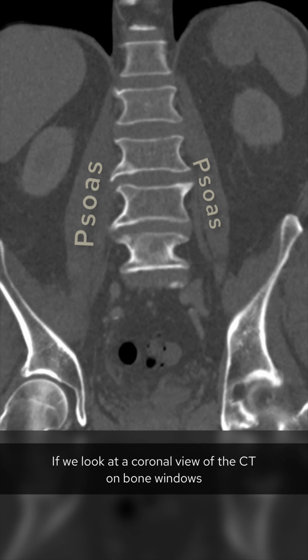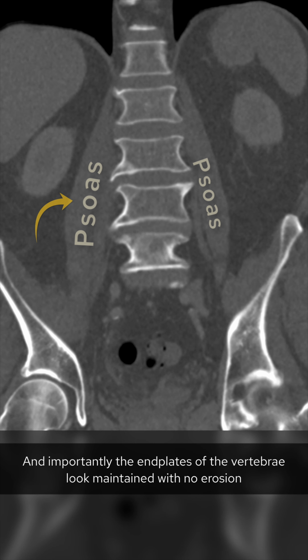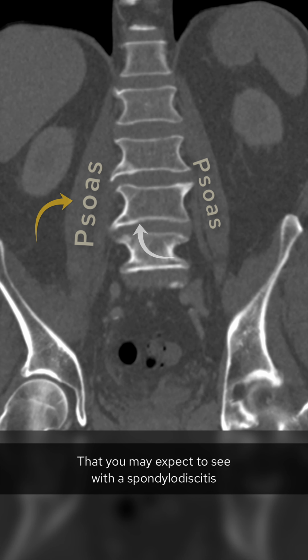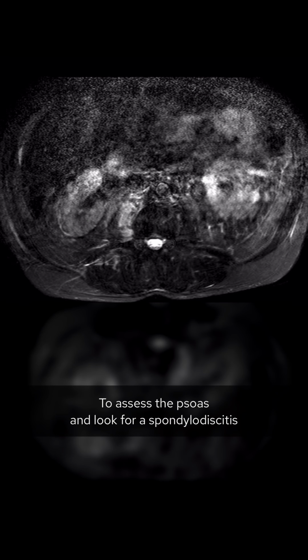If we look at a coronal view of the CT on bone windows, we again can see some subtle enlargement of the right psoas muscle, and importantly the endplates of the vertebrae look maintained, with no erosion that you may expect to see with a spondylodiscitis. The reporting radiologist picked this up and recommended an MRI to assess the psoas and look for a spondylodiscitis.